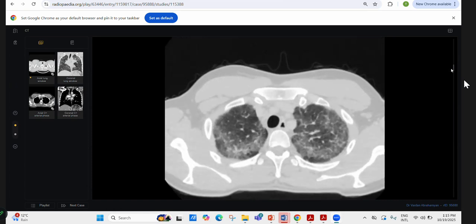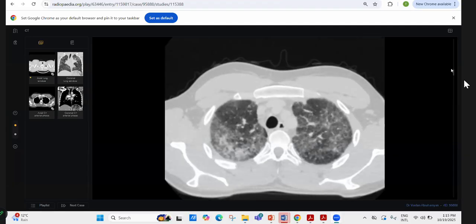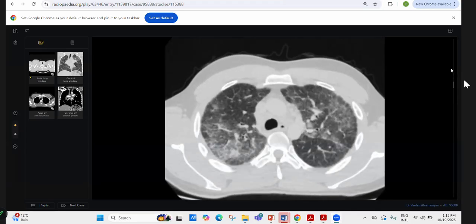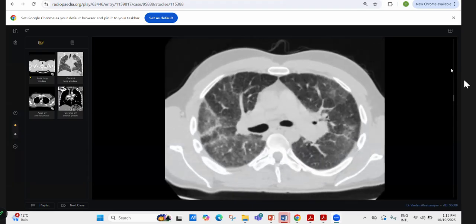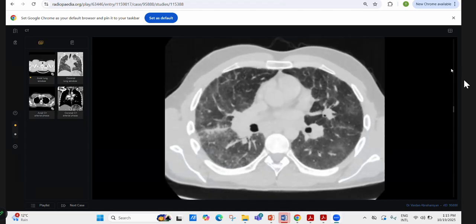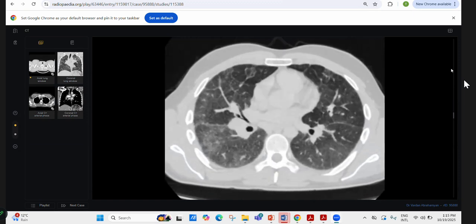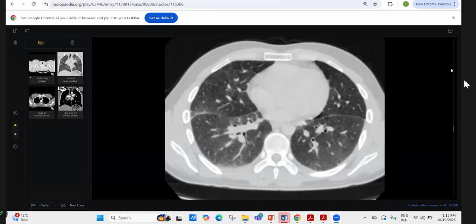I'm presented with HRCT, lung window, in which I can see bilateral ground glass haze, interlobular septal thickening in both lungs with subpleural sparing. And it is more in the periphery of the lung. There is fissural thickening also. And I can see nodules along the fissures on both sides, and multiple nodules also in both lungs.